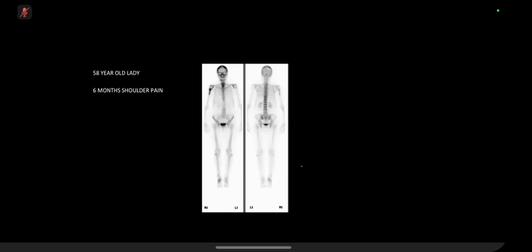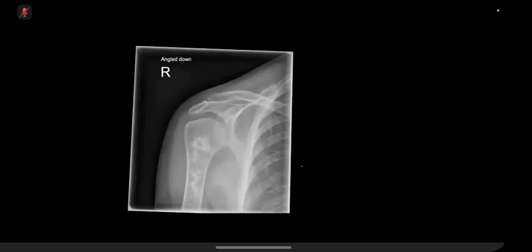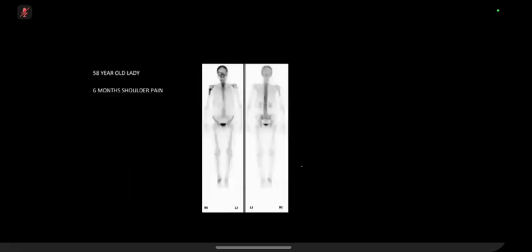I mean, not entirely. I'd have to look at CT and correlate with the other images, but just looking at the X-ray alone and seeing that there's no other areas of abnormal uptake, and I can see the renal shadows, which obviously does not always mean there's no malignancy.